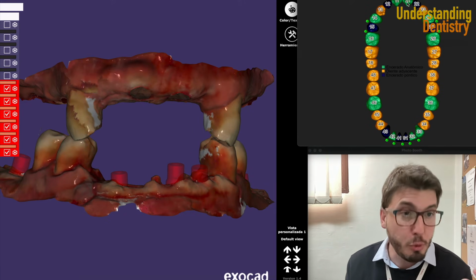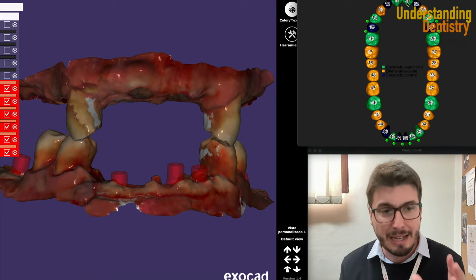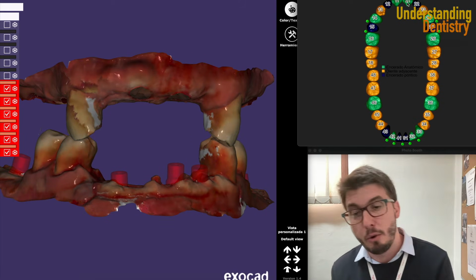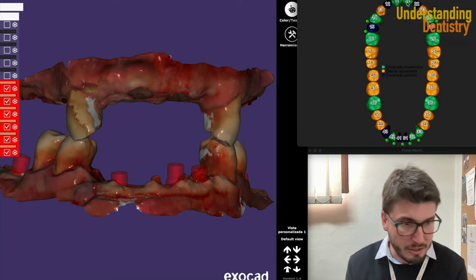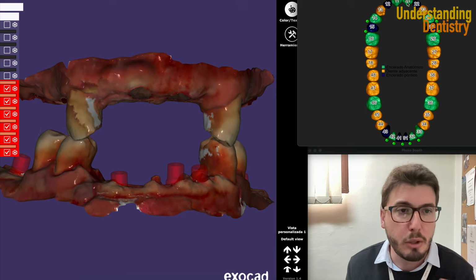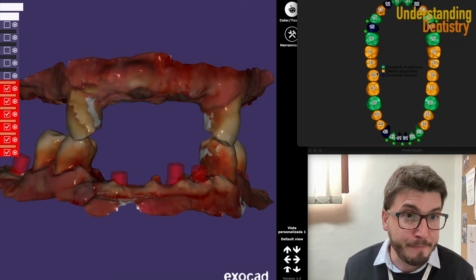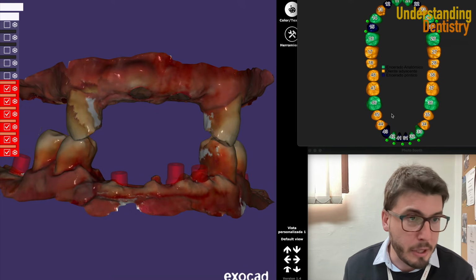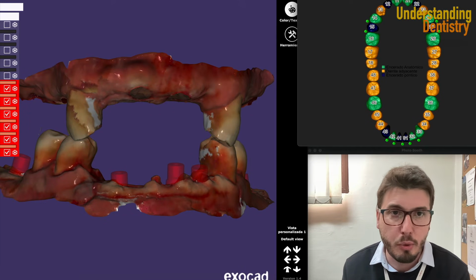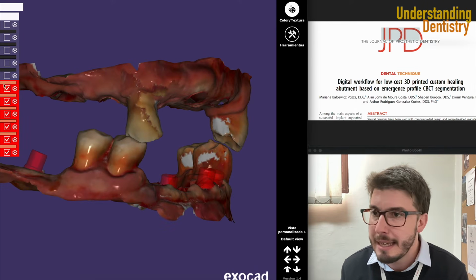You need bone volume to digitally position those dental implants, and then you need implant planning software. If you guys don't remember how to read CBCT on DICOM viewers and implant planning software, I will add both links here on the top right corner of this screen. It will show at some point. And then we have, of course, the rest of the prosthesis, and we need to understand how we are going to proceed with this planning. Okay, so let's add now the crowns.